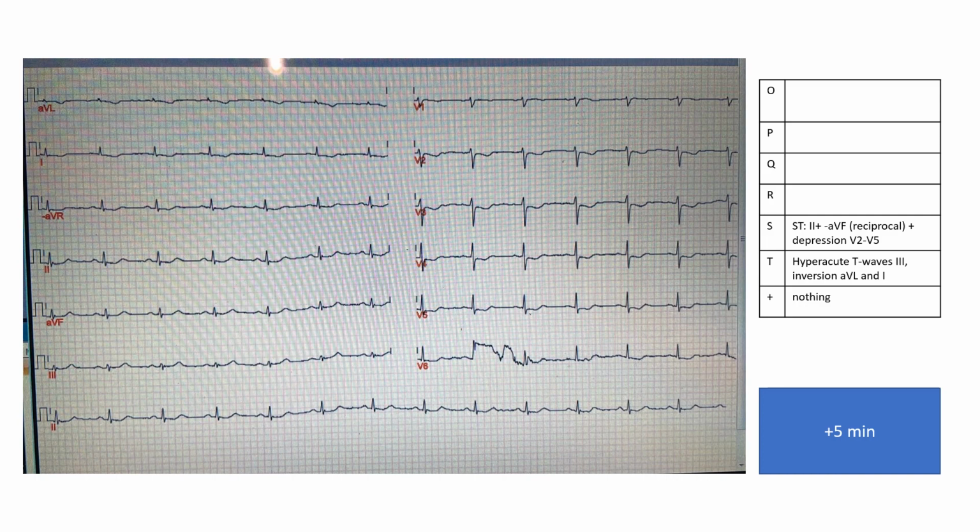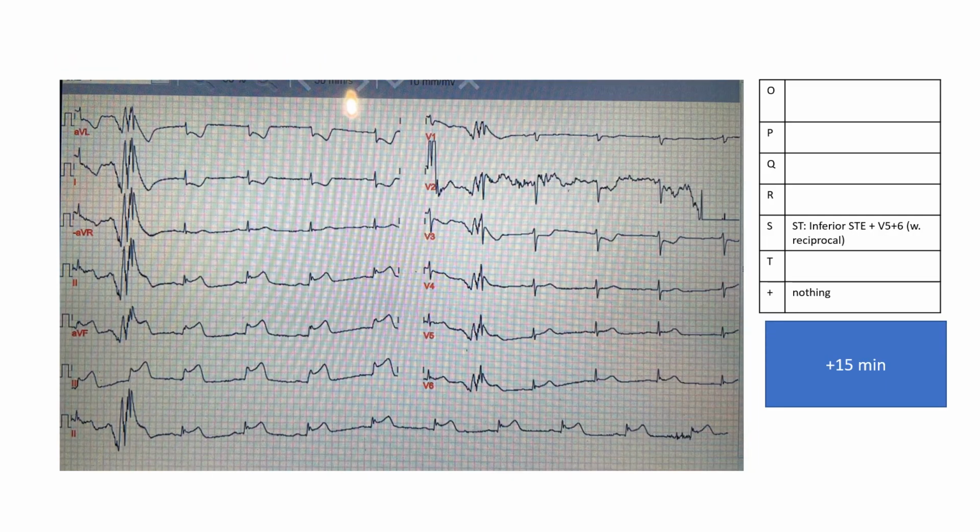So definitely now progression. And we take the ECG 15 minutes later, and now we have a definite inferior STEMI with no OMI criteria needed. This is STEMI criteria positive, more than 1 millimeter in neighboring leads, with ST depression in the reciprocals, and even ST elevation here laterally. I think the lesion would probably be here. I thought to begin with it may have been posterior OMI, but it developed to become this. All right.